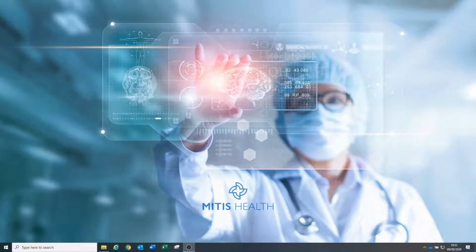My name is Barry Clyde, I am the CEO of MITIS Health, and together we're going to undertake a quick journey to highlight the MITIS Health client connecting to a hospital in Ireland to simulate what a standard user or radiologist would do working from home. I am presenting my desktop.